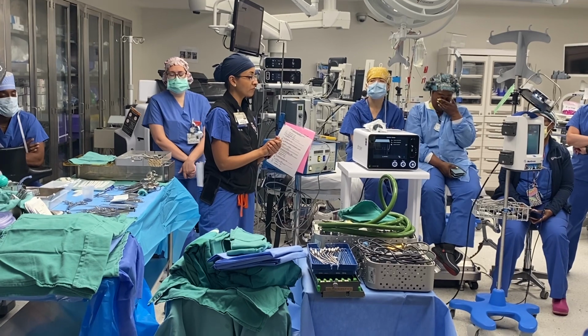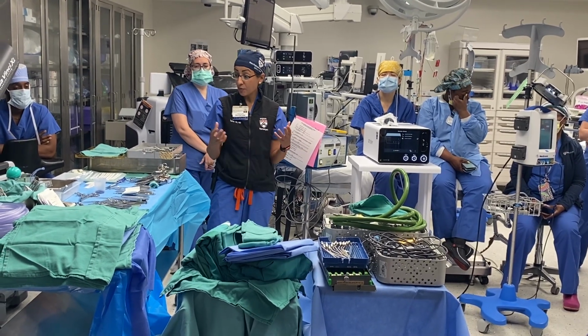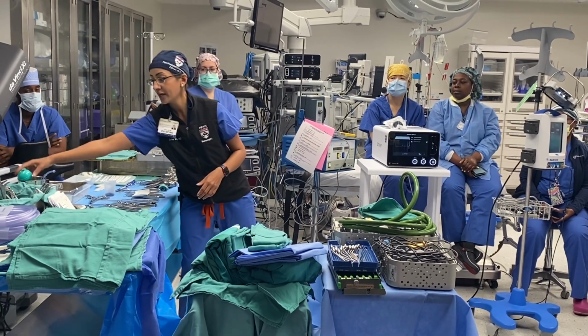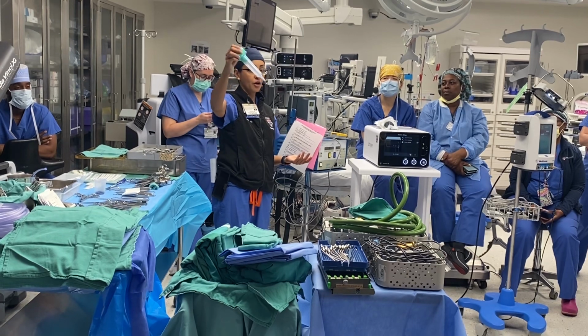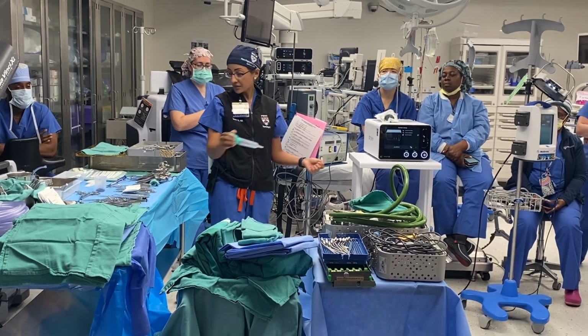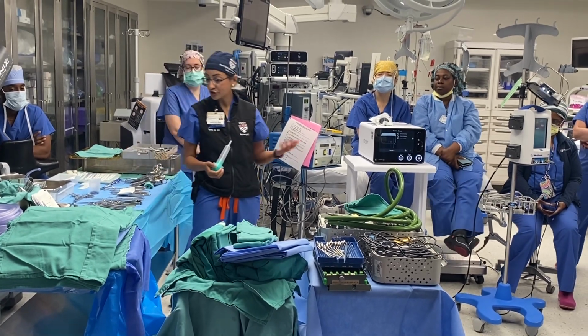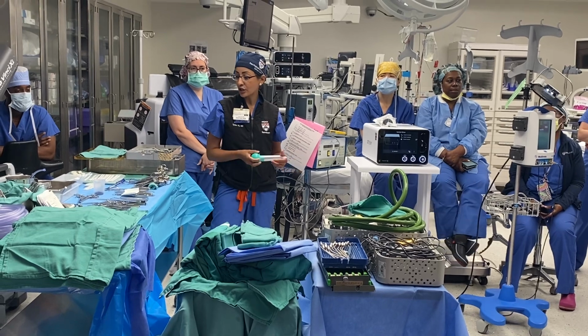So if it is a subdural hematoma at this point, we are going to use tons of irrigation. These are the big bulb irrigations. We typically will go through a ton of these, as you guys know, and we're going to irrigate and suction with those 12 French or the 8 French, and do our dissection.